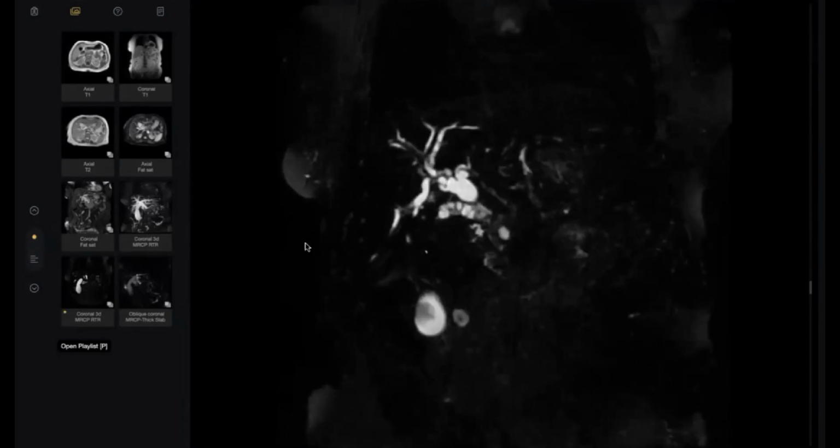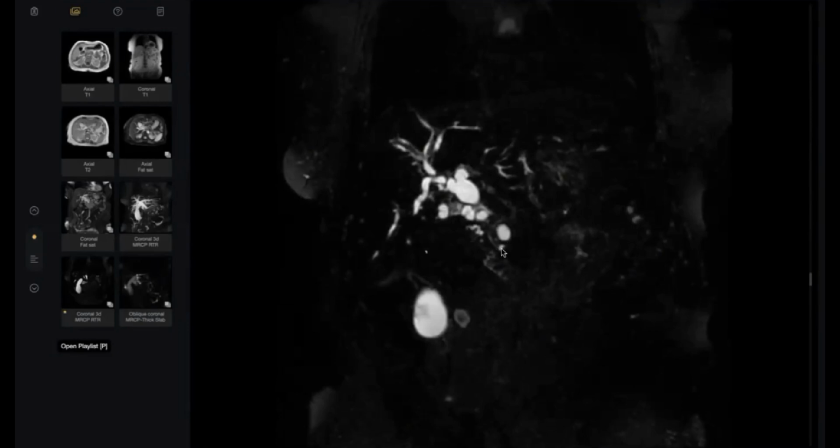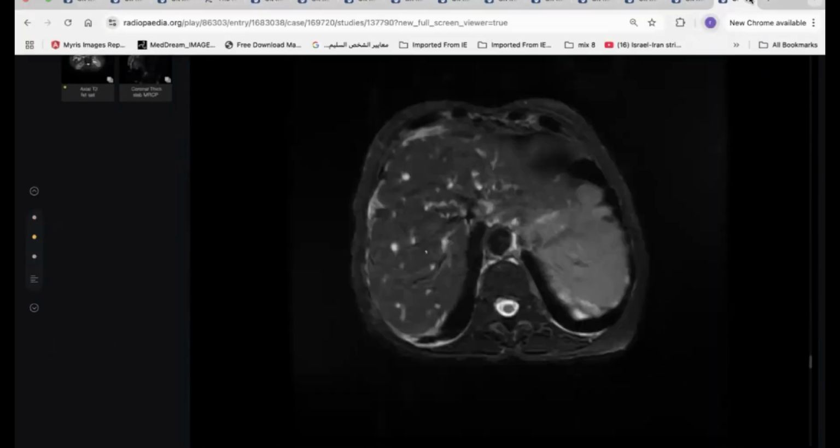And see here, here is the site of stenosis or stricture. So at least tell the examiner the possible differential: pancreatic head tumors, ampullary tumors, anyway. Okay? Thank you so much, doctor. Okay. Thank you. Next candidate.